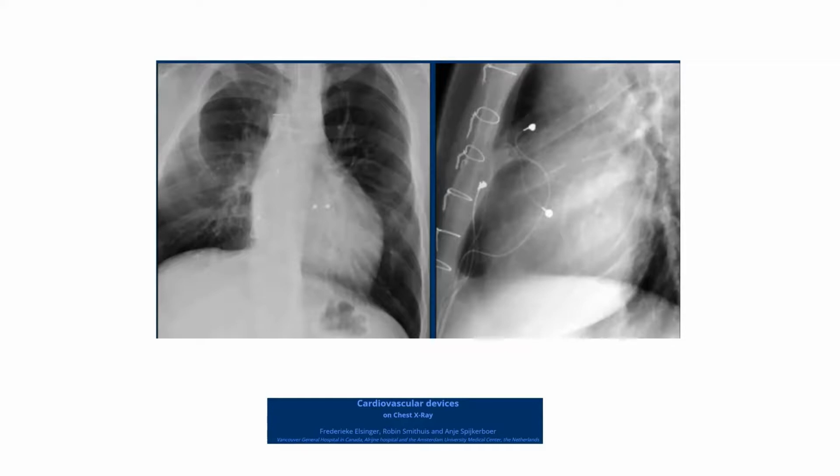Okay, so sometimes you can see it this way, and remember it is an epicardial lead. And this patient has had cardiac surgery before, because you see the sternal wires. You see the sternal wires here, sternal wires here. Okay, so this patient has had cardiac surgery. Okay, good.